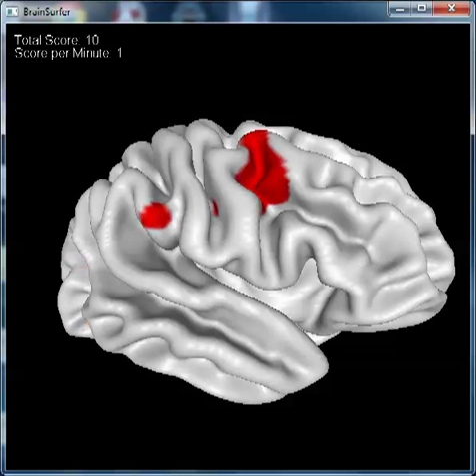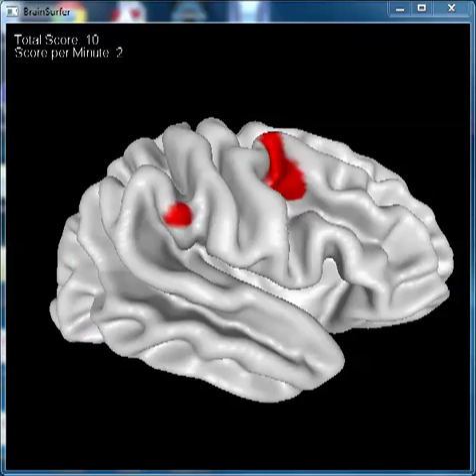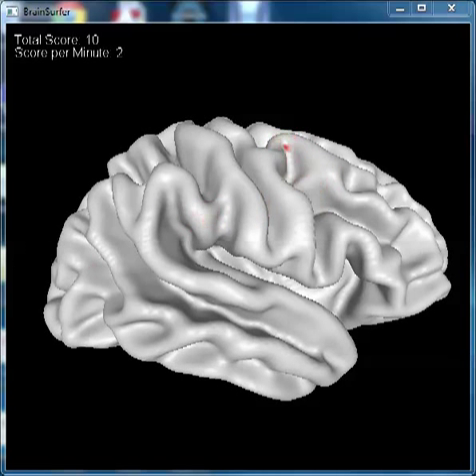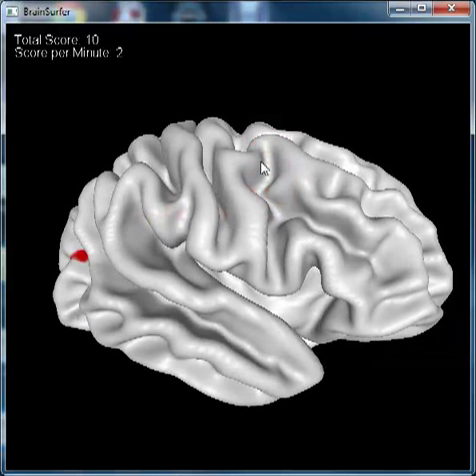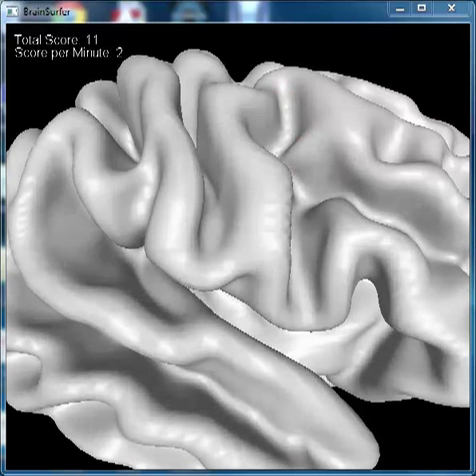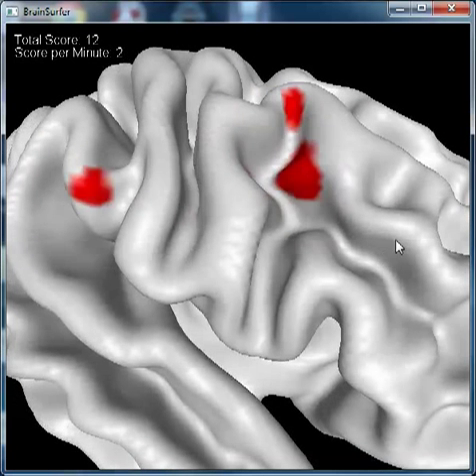We can also just isolate the right hemisphere if we wish and just examine it. So we can cut the brain in half. We can do that with the left hemisphere, of course, too. Right now we'll bring it back. We're most interested in these regions of deviation from normal that periodically occur that are linked to the patient's symptoms, and we want to train by reinforcing greater stability these parts of the brain to be more regulated and therefore the symptoms reduce. We can zoom in on these parts of the brain so we know more about them, get a better understanding of where they're located.